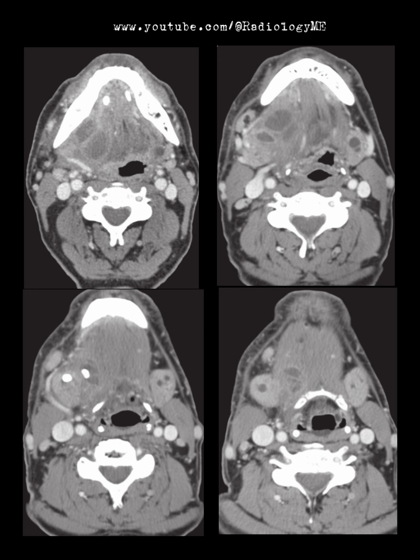Submandibular abscesses can be tricky, especially when the infection spreads from dental infections or nearby regions. It's a good reminder to always scrutinize the adjacent anatomy, like the sinuses, air cells, orbits, and even chest imaging if you're considering hematogenous spread.